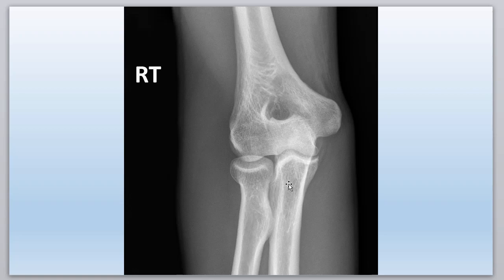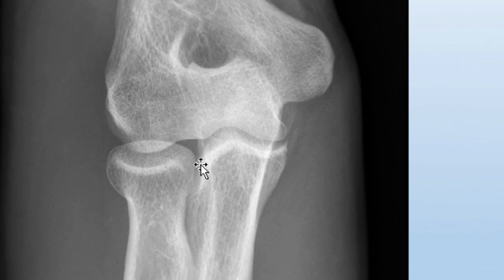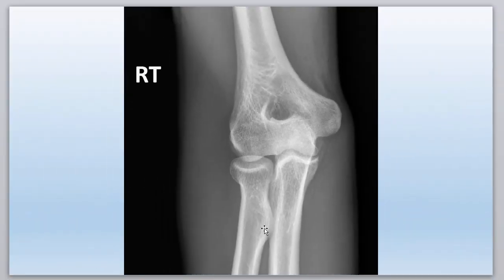And then let's look at the ulna here. We have a divot right here. Okay, so that is the radial notch of the ulna. In all these structures: head of the radius, tuberosity of the radius, so the radial tuberosity. Don't forget to include that.